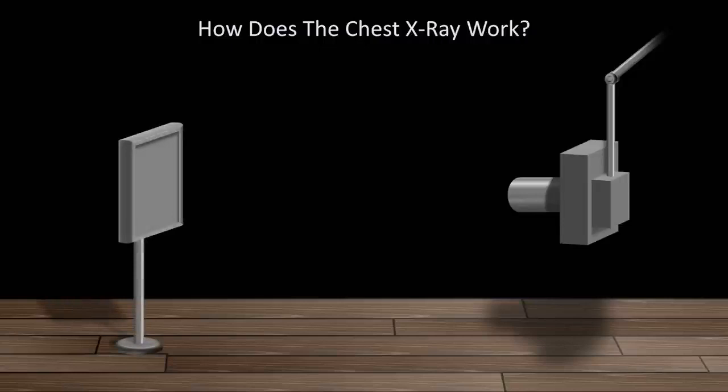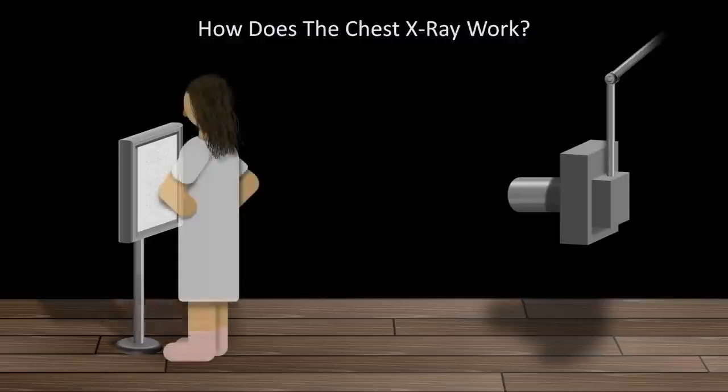For the first 100 years of X-rays in medicine, the detector was a photographic plate or film. I'll add a sheet of unexposed X-ray film here. Now, however, most hospitals have replaced these with digital detectors, which allow for real-time viewing as well as improve post-exposure digital manipulation. Finally, of course, we'll need a patient to stand in between the source and the detector.